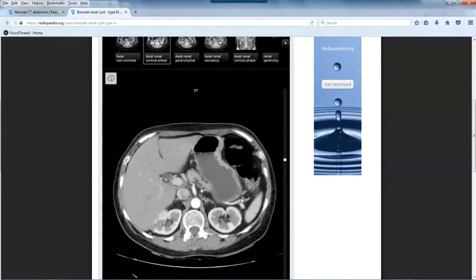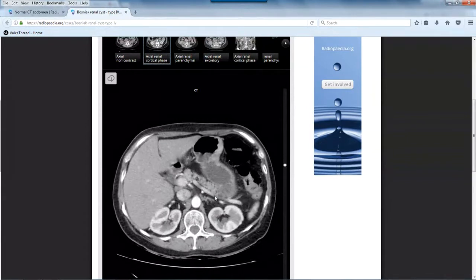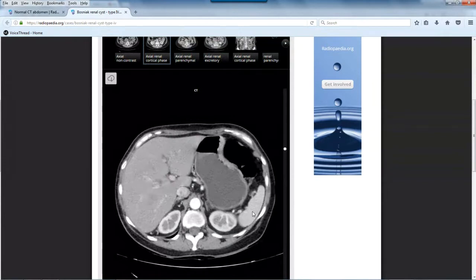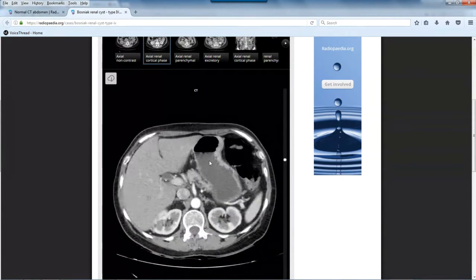And it's going to follow right along. It's not a really good phase. Right along, it takes a sharp turn here to the spleen. Okay, that's your splenic. And your left gastric is off of here. It's really small. It's very hard to see on this.